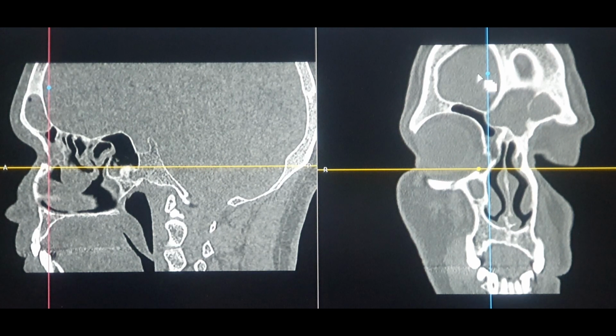Now many young guys I've seen in the hospital where I used to work before, I used to see residents considering this as the frontal sinus sometimes, but no, that is not the frontal sinus. That is the frontal lobe of the brain actually. Everything seems to be of the same iso-intensity over here, the soft tissue density. So that's why a lot of times these people get confused. This is a place where you need to differentiate between the frontal sinus and the frontal lobe of the brain.